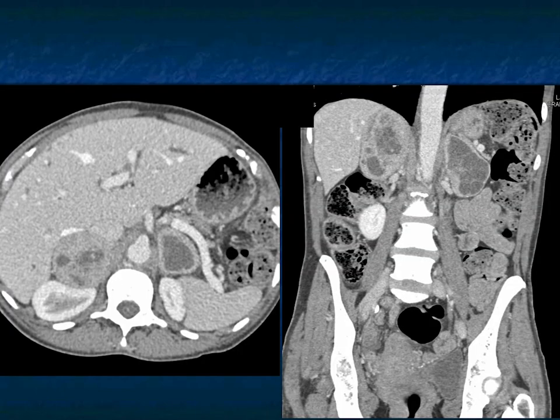What's your best diagnosis in this case? Well, from the axials and coronals, I'm showing you bilateral adrenal masses. They look, particularly on the left, cystic, though on the right it looks cystic as well. So what can give you bilateral adrenal masses? Adenomas, okay? But this doesn't look like adenomas. Metastasis. Metastases have a range of appearances.